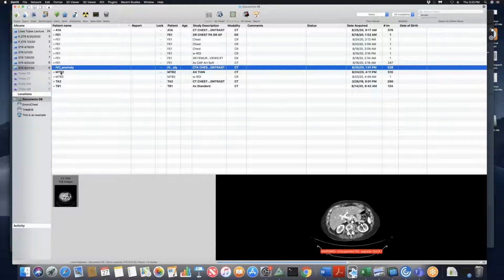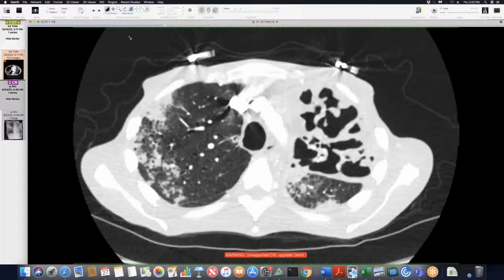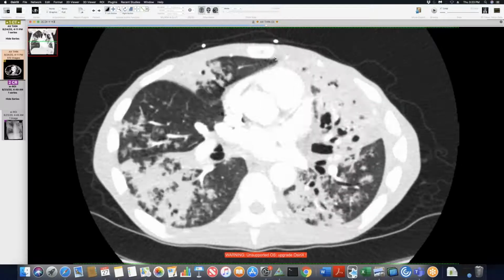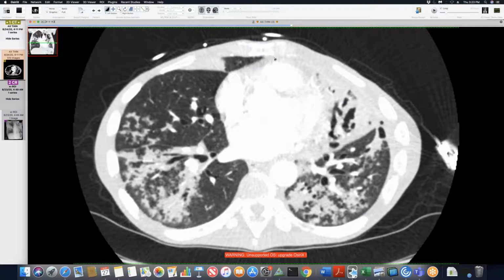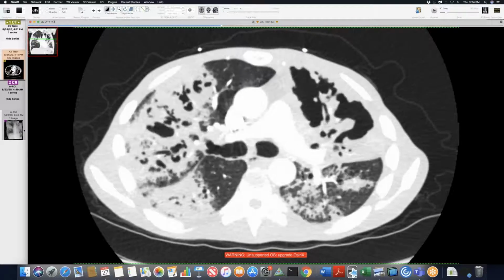This is a case I had on Monday. I showed something similar last week, but this was a really impressive look for this. So this patient came in and got a trauma chest, abdomen, and pelvis CT at our county hospital. But we'll start off with the radiograph.